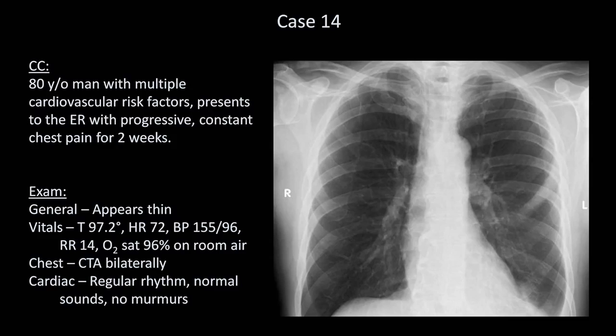When a patient with risk factors for acute coronary syndrome presents with chest pain, the X-ray is usually ordered to rule out so-called don't miss diagnoses. For example, to make sure the mediastinum isn't wide, suggesting an aortic dissection as the cause of pain, and to make sure there isn't a big pneumothorax or pneumomediastinum.